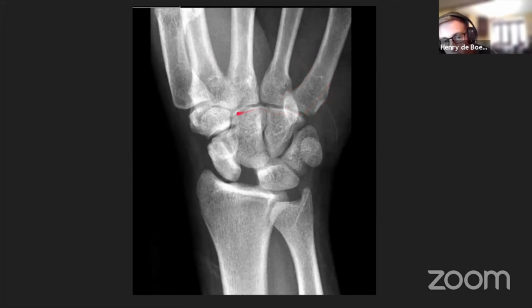So I don't think there's a fracture. I think these cortices are all intact. Maybe it was this that someone was looking at. Now, this is just very smooth. There's no break in the cortex. I think this is what we call a nutrient vessel. I don't think that's a fracture, but for spotting it, well done. If you're concerned and you're not sure, treating it as a fracture and bringing them back for follow-up is not a bad plan.